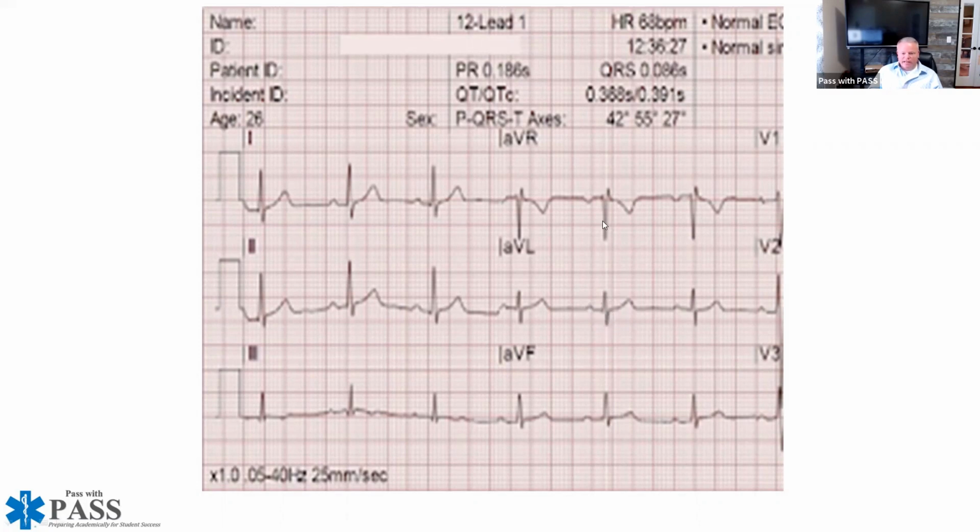You can see clearly AVL is not your answer, and 1, 2, and 3 are not going to be your answer either. So AVL, again, this is just another picture of the EKG that we were just looking at: half going up and half going down. And AVR is just blended in up there as far as the printout.